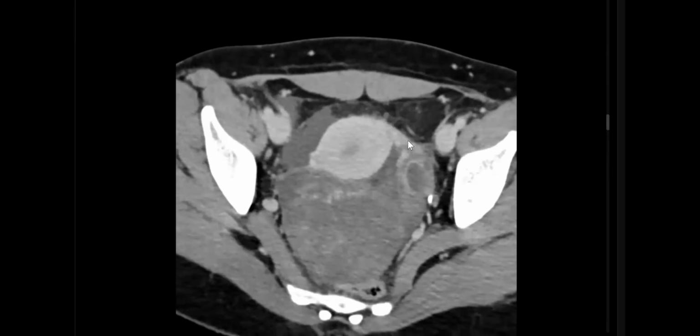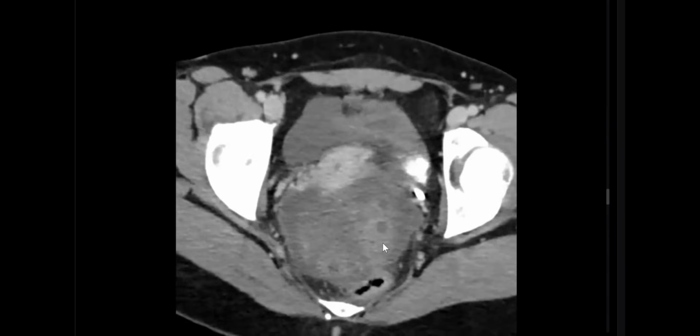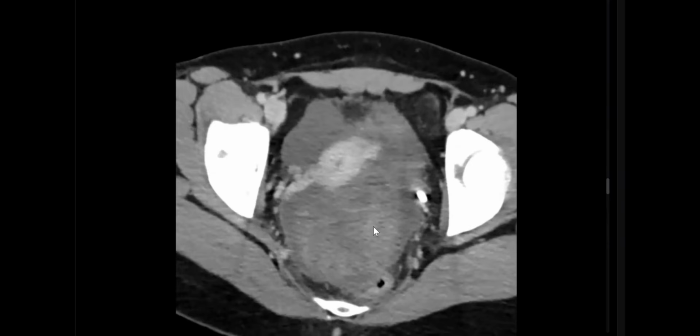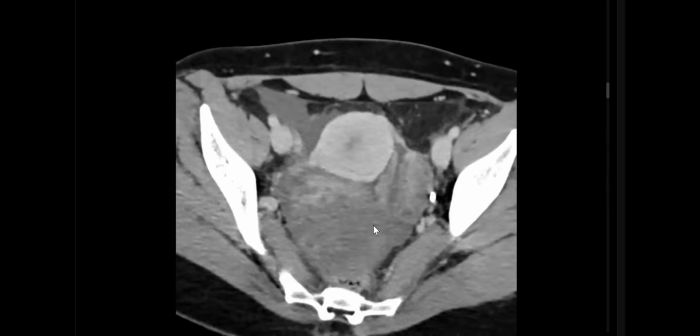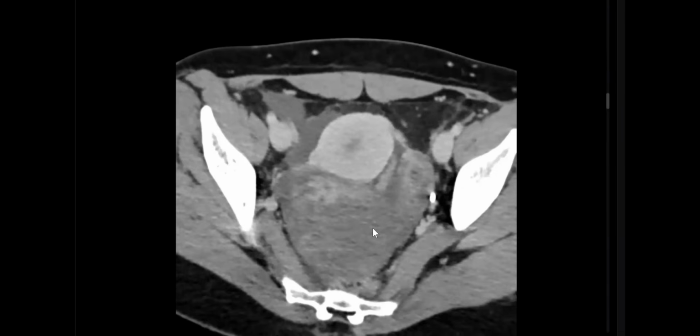Show me where is the suspected area of the torsion. Okay, this one. What about the pedicle, the posterior located structure? This could be a bleed. How to confirm this? Because CT may be defective in gynecology. How to confirm? Any other additional study? Ultrasound and MRI would be of help.